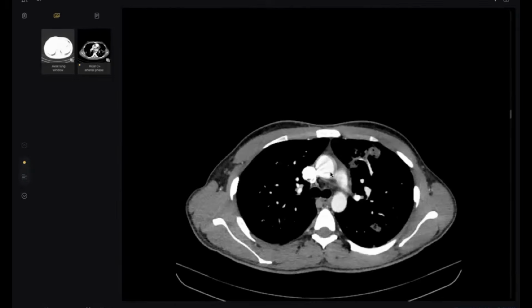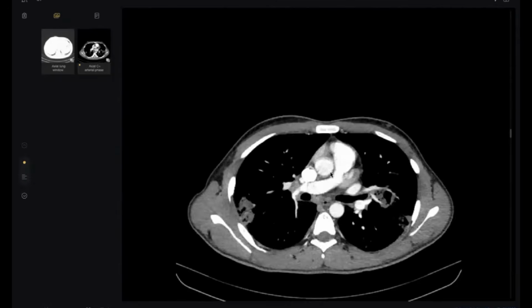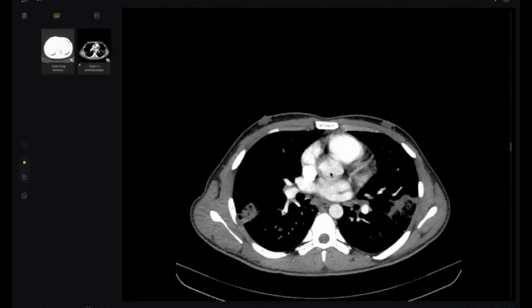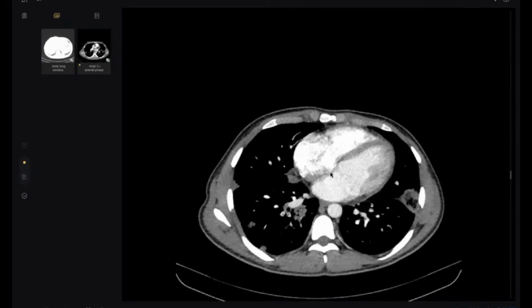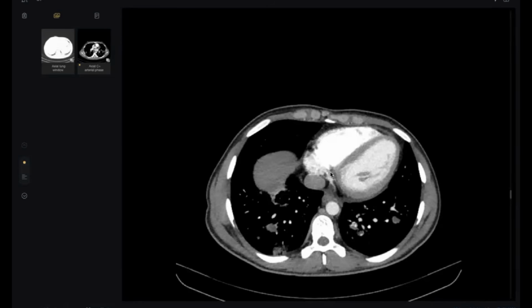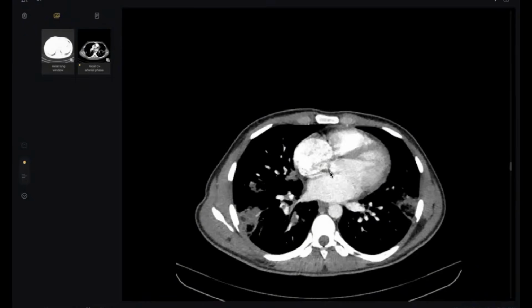I wish from you also to give us some other differentials. Doctor, why didn't you include other differential diagnoses in this CT, like Wegener's, or cavitating metastasis? That can be, but actually I saw the thrombus. And what else? We have a long list of differentials for cavitary lesions.